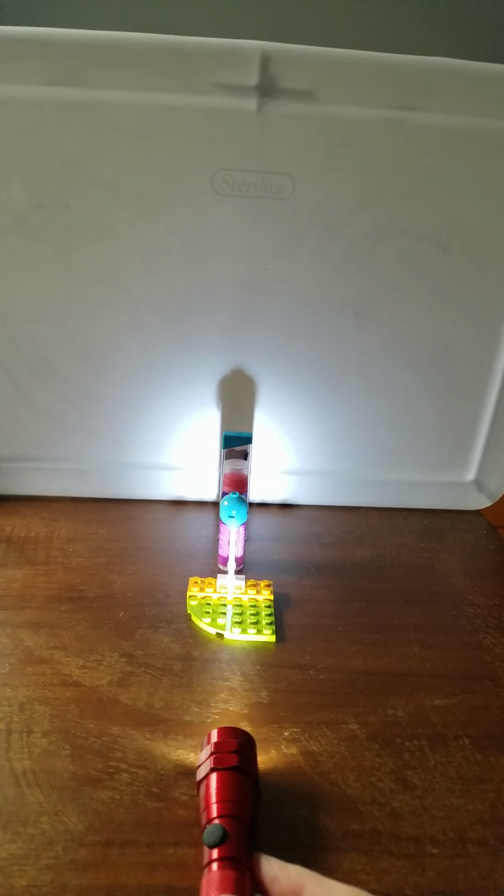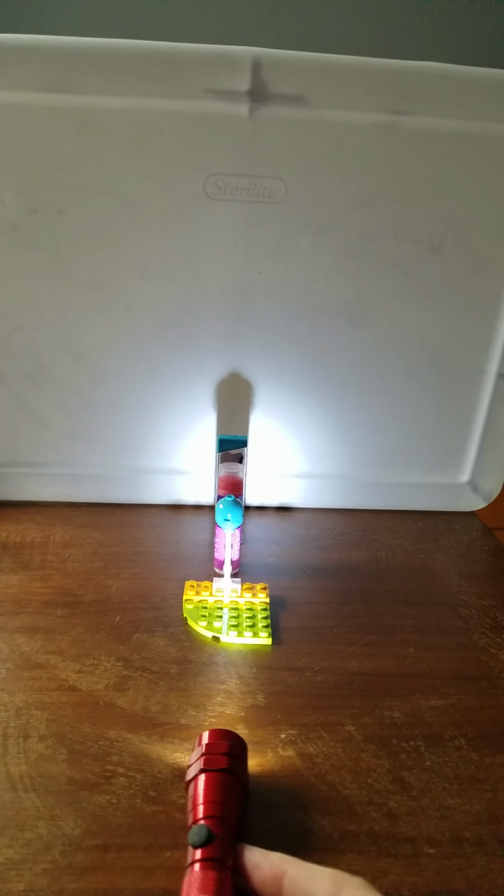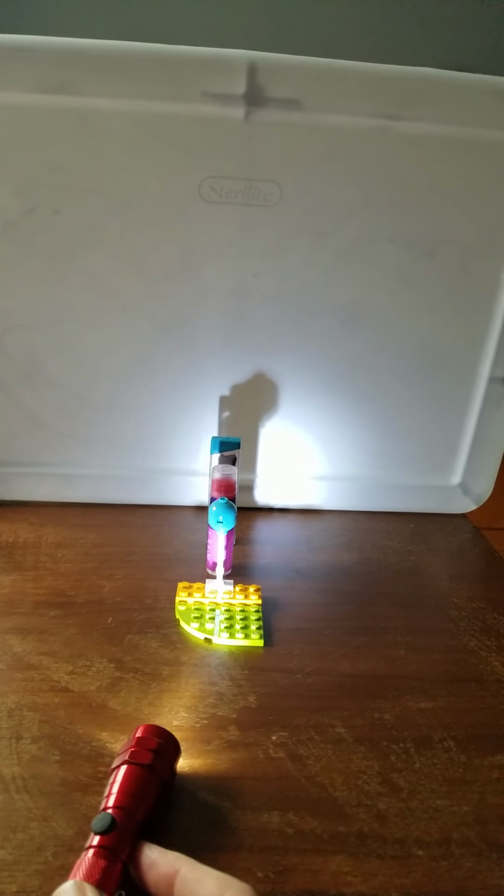So if we come back and line it up perpendicular, everything's superimposed, and now we shift the beam mesial, and look what jumps out over here. I'm trying to get the beam so that it really highlights it well. But look what jumps out in front. Again, it's that circular little lollipop-shaped buccal object. So the buccal object is going to move in the direction that your beam is pointing.